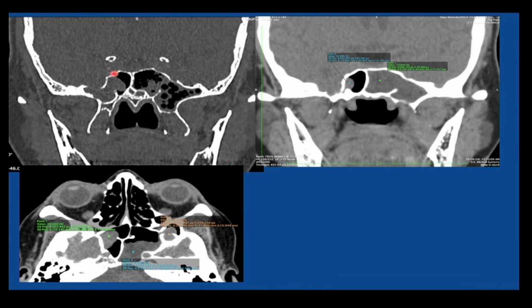Multiple defects. So sphenoid sinus, and remember normal variants, pneumatization of the lateral recess, correct? So the pneumatized lateral recess wall is very thin. Very high chances of that getting a fracture in trauma. But this patient never had any trauma. So there is a defect in the superior wall of the sphenoid sinus, and there is opacification.